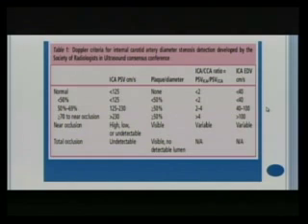Now we are all familiar with this criteria, but I still wanted to go over this again because this is the principle, or the yardstick, by which we are measuring all velocities and assigning a particular range of stenoses. As we know, normal and less than 50%, their values are pretty much the same. But the only difference between a normal and a less than 50% is that the plaque is insignificant or negligible in the normal category, whereas there is some amount of plaque in the less than 50% category, whether it's calcified or not calcified. We've gone through that before.